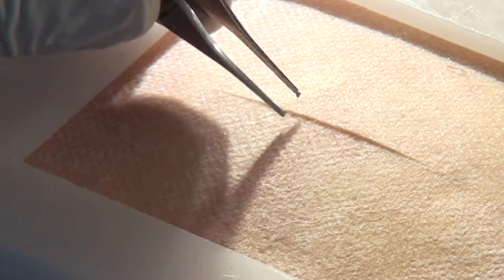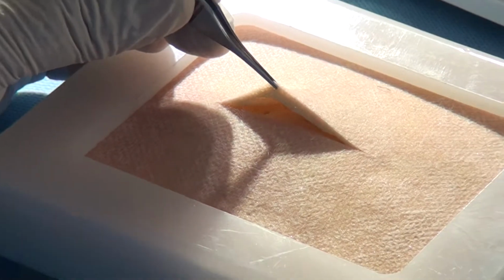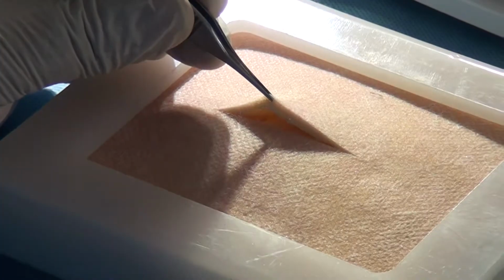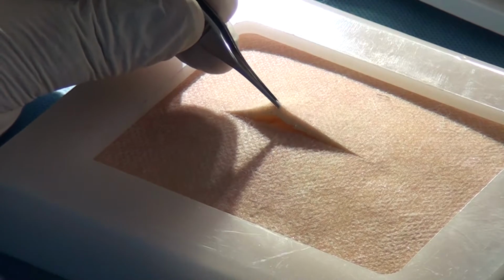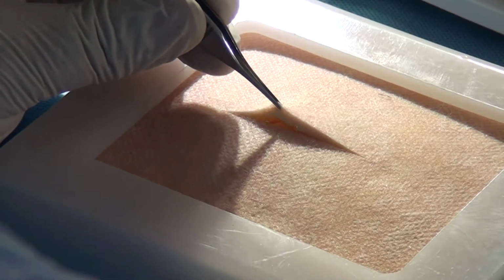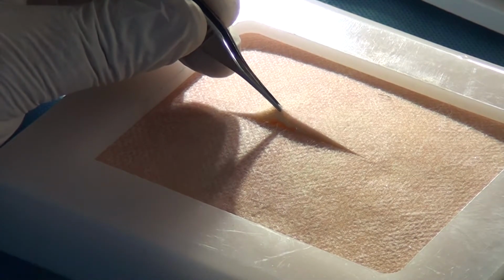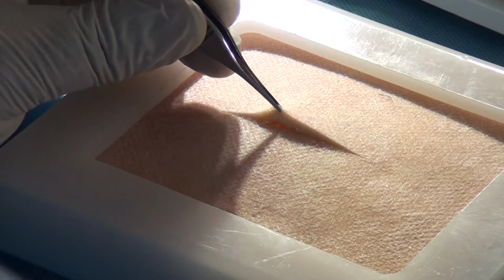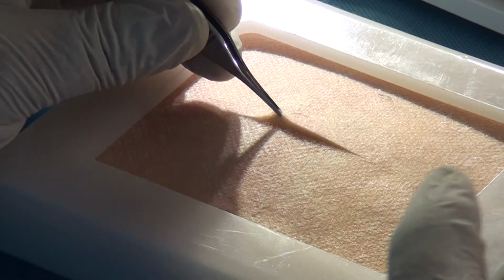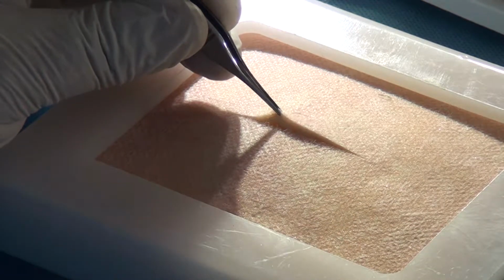And what is the advantage of a tooth? It can hold well and it can hold tough structures better. If I hold it with a plain forceps, I'll have to apply a lot of force. But if I have too many teeth, I'll traumatize it. So you must know that vital structures are not handled by tooth forceps and tough structures are not handled by plain forceps. There was a study conducted.